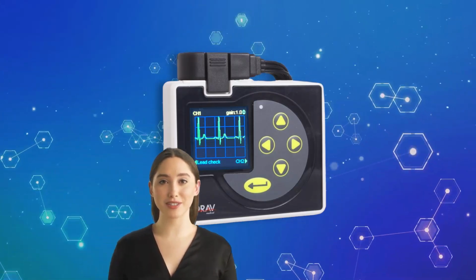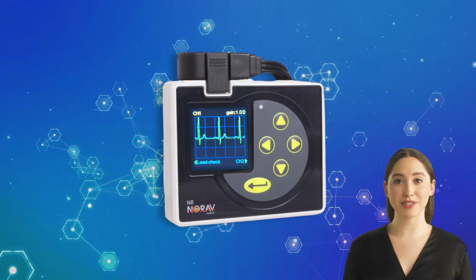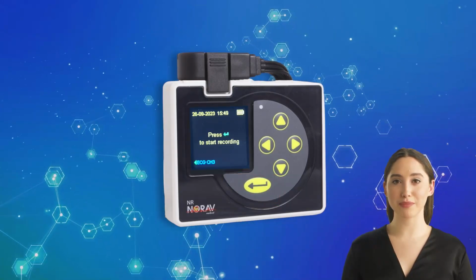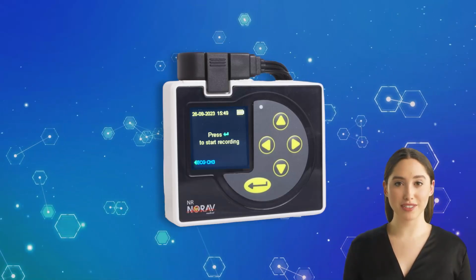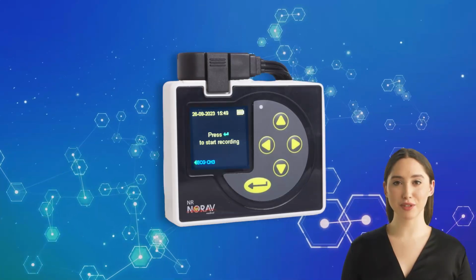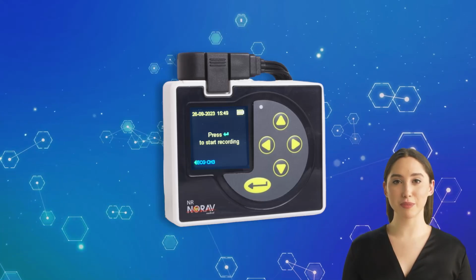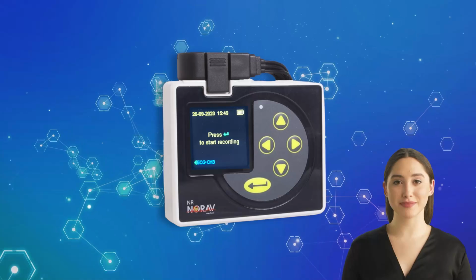Lastly, let's start the recording. Complete all prior steps before proceeding. Press the Enter button on the recorder. For model-specific details, consult the appropriate manual. It's important to remember that NORAV recorders come with an auto-start recording function. If you forget to manually start the recording, it will automatically initiate within several minutes, assuming all previous steps are completed. Well done! You've completed the preparation for Holter recording.